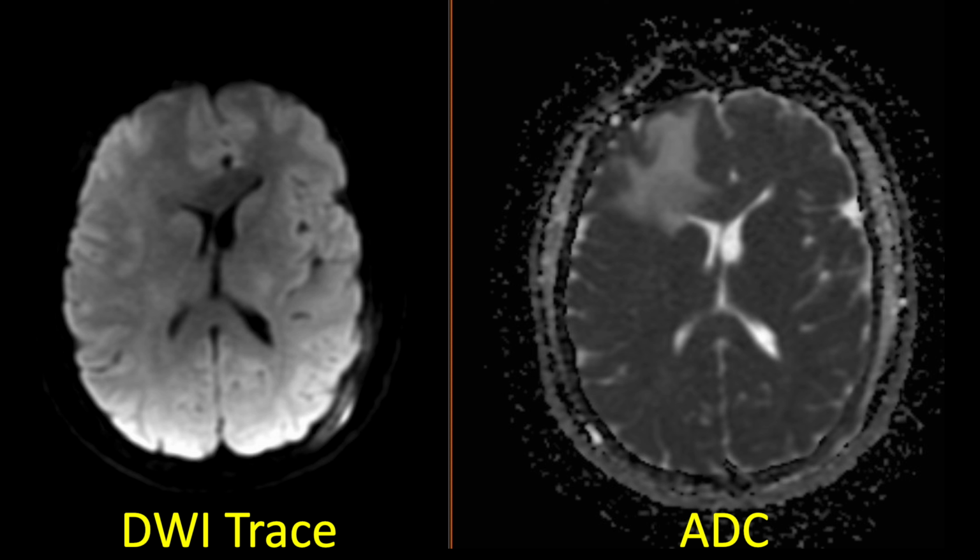There's another finding here. What's this? There should be no restricted diffusion here within the skull. It turns out this person also had lymphoma metastases to the skull, a good reminder that you always need to explain restricted diffusion no matter where it is.